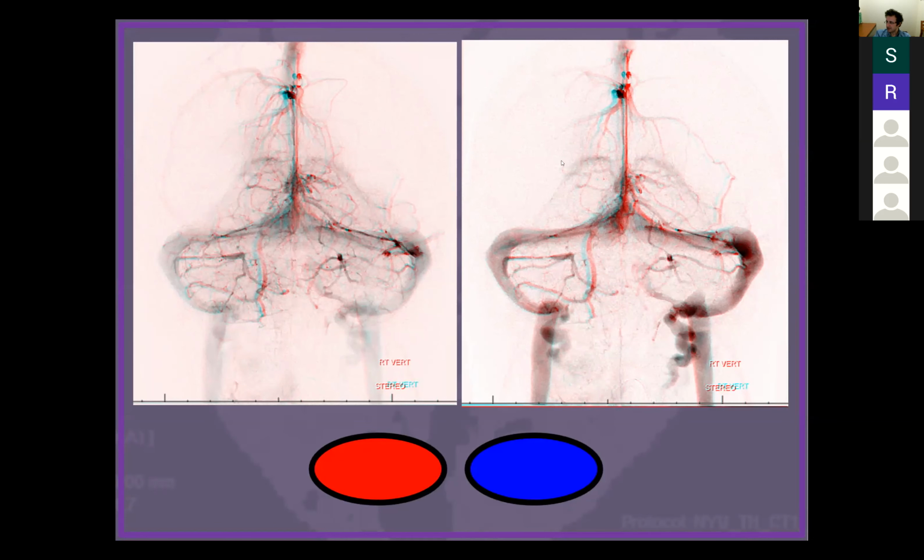Right here you see all these sinuses. You see the blush of the lateral ventricular choroid plexus. That's a relatively constant thing too. That helps you identify where that is. Again, you see this line. You see this line. So these lines are your tentorial sinuses, right? Sinuses of the tentorium cerebelli.